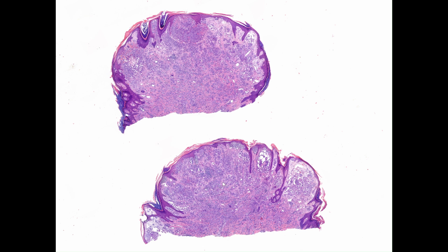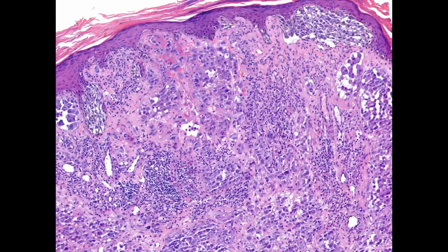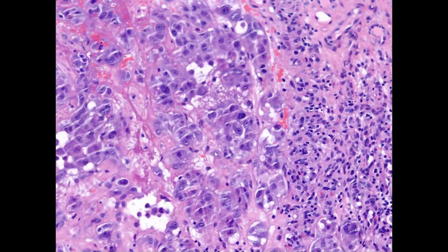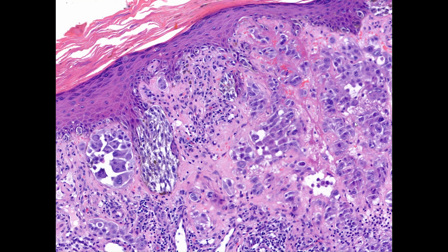The stains that you're going to see, all the work was done by the referring laboratory, not by me, although the approach works. First of all, how do we know that we're seeing a tumor of Spitz lineage? Well, two key things. We're seeing large melanocytes and we're seeing surface acanthosis. So we've checked those two boxes.